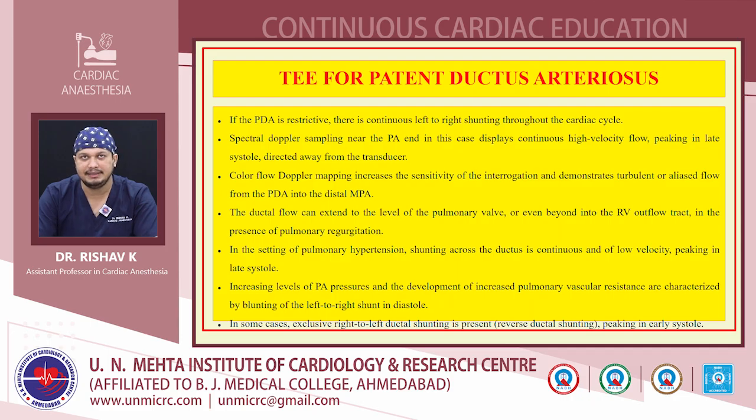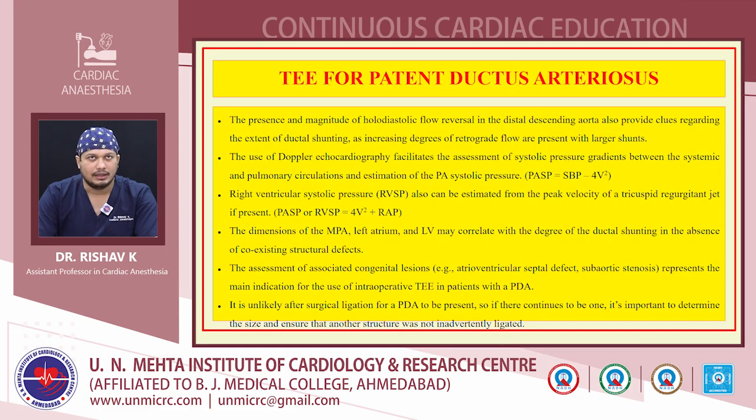So these are the characteristics of the blood flow which passes through the patent ductus arteriosus. We have to try our best to evaluate both the anatomical features as well as the flow features by using 2D echocardiography as well as by using color Doppler and spectral Doppler.